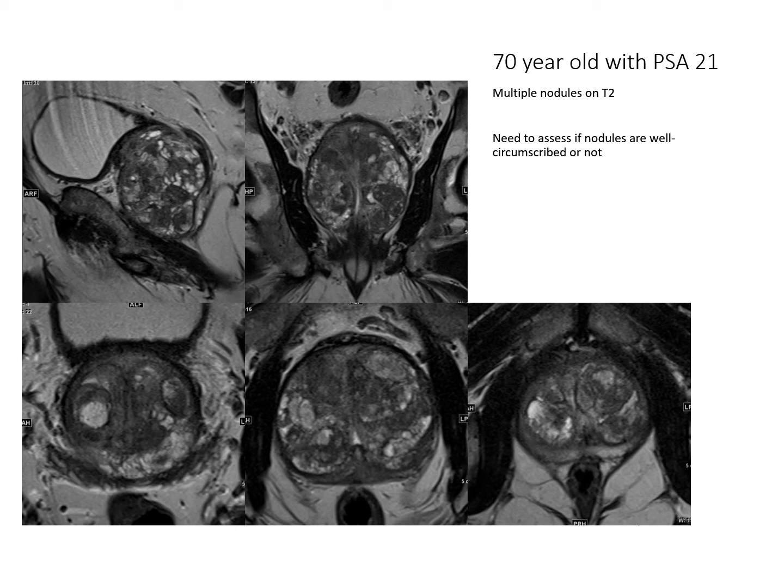Okay, so this is another case where it's a good example of BPH. Okay, so look, the gland is pretty massive. Okay, and it's really the transition zone that is enlarged, and you can see that sort of stained glass window appearance of the tissue where you've got these nodules. They show varying sort of shades of gray, but if you look, all the nodules are pretty well circumscribed. Okay, they're pretty well circumscribed discrete nodules, and if you're not sure, you can cross reference in different planes. Okay, so you can be reassured that that's probably normal. And this was confirmed on biopsy that there was no malignancy.